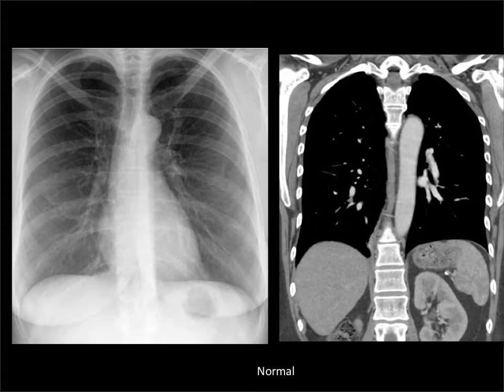Let's track out a little bit right here and see another vertical line. Now, if you look very closely in the middle of chest X-rays, down over the spine, you'll see another vertical line. So this was our para-aortic line, but there's another vertical line there. I'm going to blow it up and undo it in a minute so you can see it a little bit clearer. But that line is called the azygoesophageal line. Here we have the azygos and the esophagus together, and there is air up against them that produces a line.